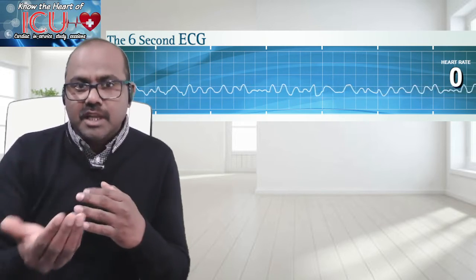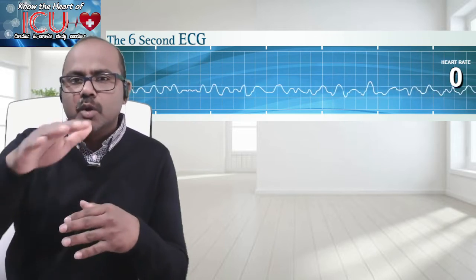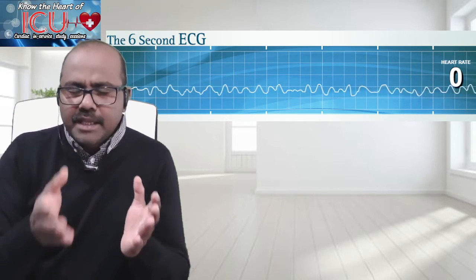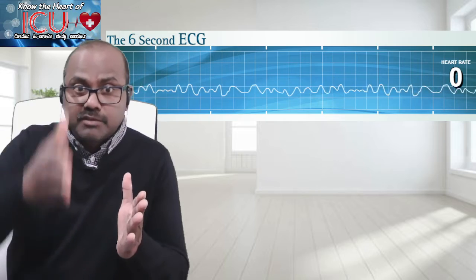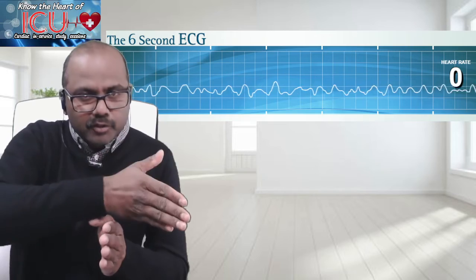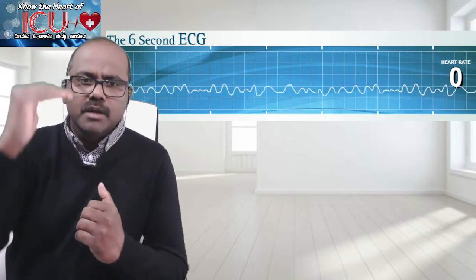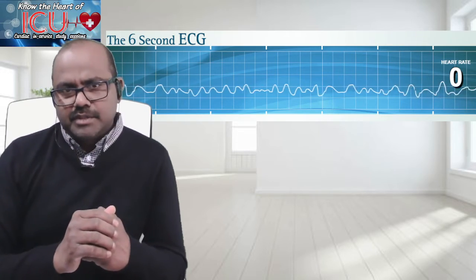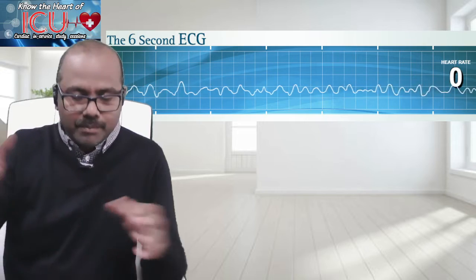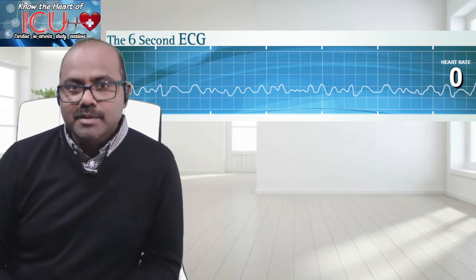And it's easy to identify atrial flutter, sawtoothed, and atrial fibrillation, no discernible P wave. And if it's from the AV node, there may not be any P wave at all, but the QRS will be narrow. If there is a P wave, it will be inverted, and it may be before the QRS or after the QRS, but it will be inverted, based on high nodal, mid nodal, or low nodal rhythms. And if it is of ventricular origin, blindly you can say wide, bizarre complex, it's ventricular. So it's an easy job, but you need to practice.